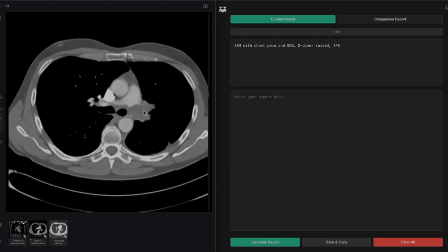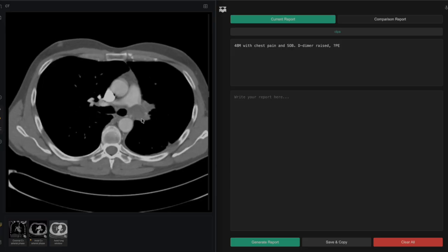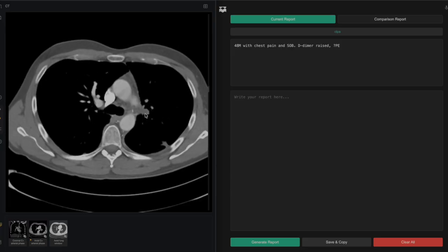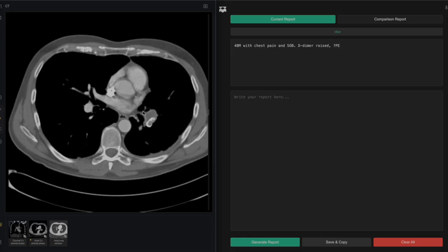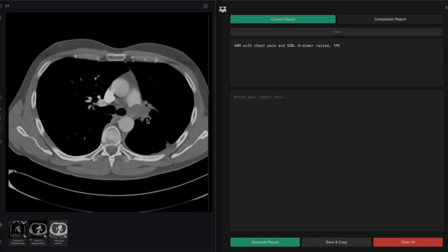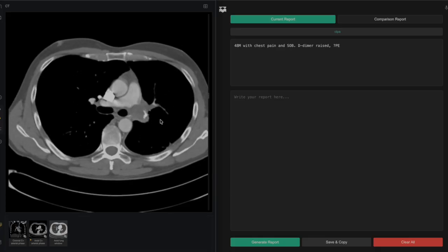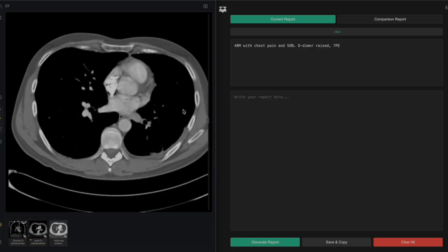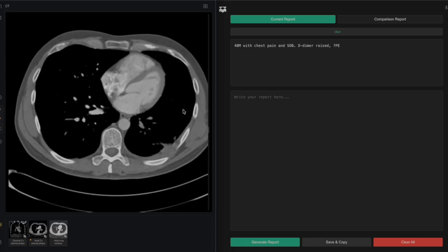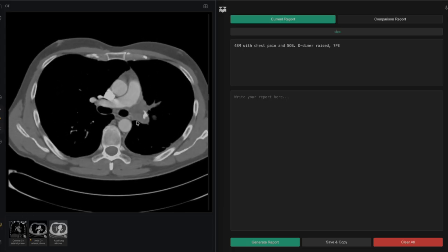We're really used to seeing thrombus or emboli within pulmonary arteries, but they don't cause this kind of expansion that we're seeing in this case. The calcification again would be quite an unusual feature for an acute pulmonary embolism. You can get calcification in chronic emboli as they remodel, but really it wouldn't be something we would see in the acute setting. So lots and lots of abnormal features in this case.